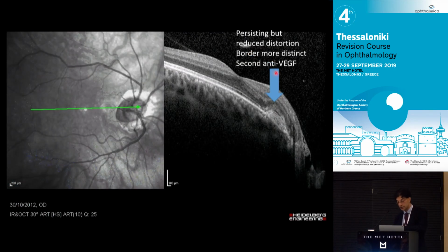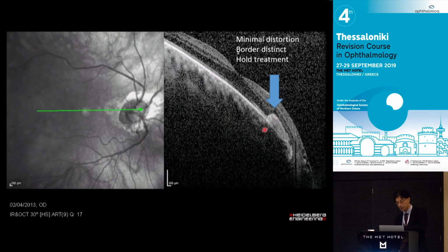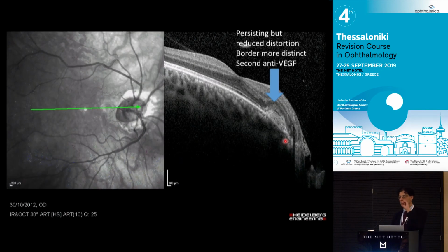And if you treat, you start getting a more defined border. There's a little bit of subretinal fluid that's now visible. And the endpoint of treatment is an incredibly well-defined border, which is where the RPE is growing over the top of it. And we think the RPE has anti-angiogenic properties, and that's your endpoint of treatment. So type 2 CNV can look quite different on an OCT in young patients. Usually in the older patients, it's very florid with lots of fluid and leak. But in myopic membranes, very subtle and can be quite small.